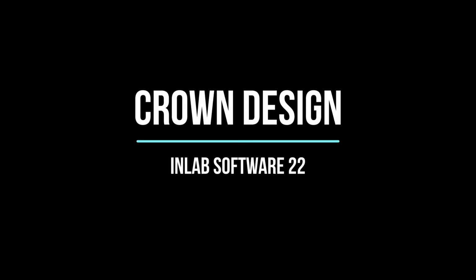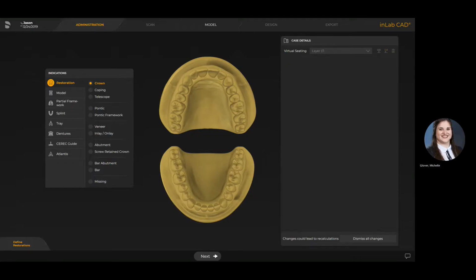Hello and welcome. This is a tutorial for crown design in the new inLab software 22. Here, if you're an existing inLab user, you'll see that the options are all still the same. So this is your administration screen when you're in the inLab CAD software.